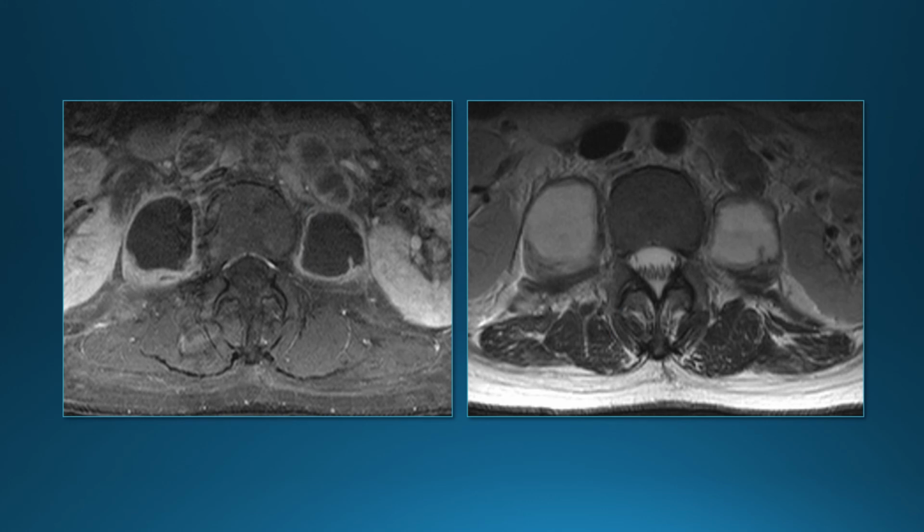Another patient with tuberculosis, big psoas abscesses. These are called cold abscesses, I guess because they don't have the same kind of inflammatory process as you see with a pyogenic infection. But big psoas abscesses are a tip-off that we're maybe dealing with a mycobacterial infection.